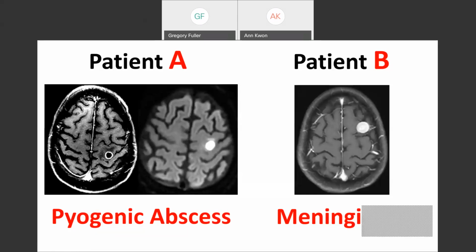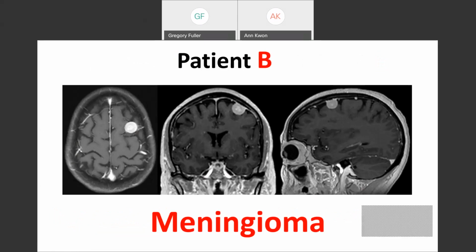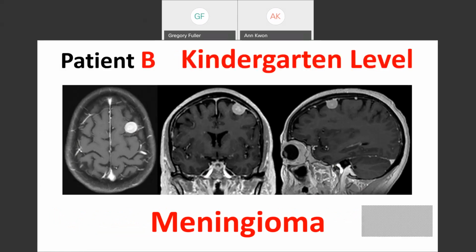Okay, do you like that as a meningioma? Or do you not like it? Did you expect me to give you these 2 sequences, the coronal and the sagittal? Well, if I had shown you those instead of the axial at the plane where I showed it to you, we would call that kindergarten level, and I didn't want to back all the way down to kindergarten, right? So I bumped it on up to freshman level. Okay, there will be better challenges coming, so just hold on.